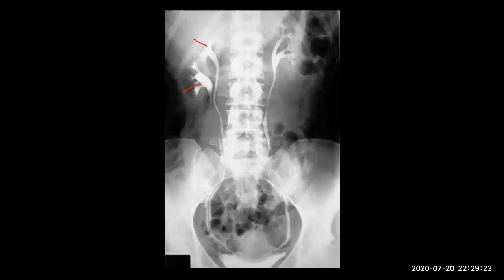But what about the lower moiety? Prone to reflux. Orthotopic insertion, meaning in the right position, okay. And it is prone to reflux. Very good. So this is the Meyer-Weigert law. The upper moiety is ectopic in position, inferior and medial, and prone to obstruct.